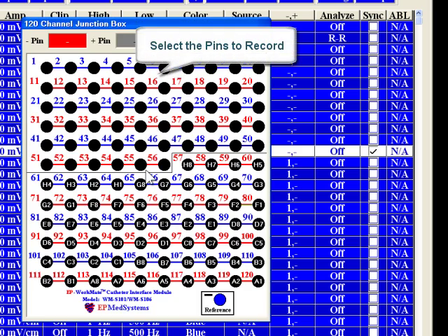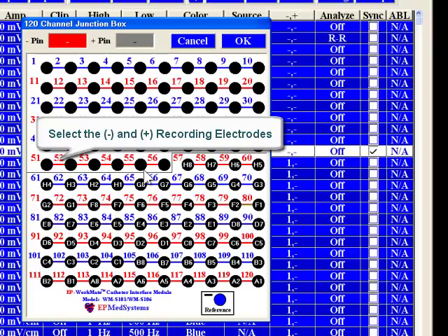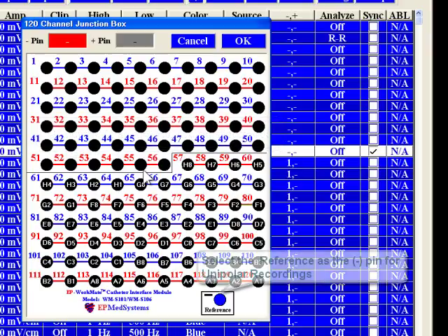If we chose box, meaning that this is an intracardiac channel, in the negative-positive column, we must select the specific pins from the pin box. So when you select the negative-positive column and you've chosen box, you get a picture of the pin box. The pin box is either 56 pins or 2 pin boxes equaling 120 pins based on the size of the amplifier.